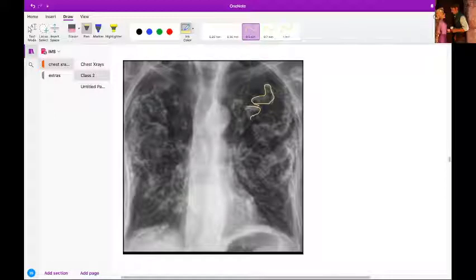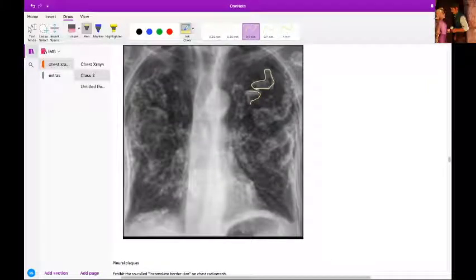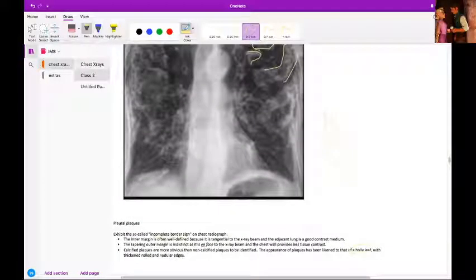Asbestosis, yes. Okay. So it's not that you cannot say asbestosis, but you can say asbestos exposure. So these pleural plaques give the appearance of a holly leaf, apparently. Something that looks like that leaf. Okay, so yeah, this is pleural plaques. I just kept it in the middle. This is not that important, we'll just skip it.